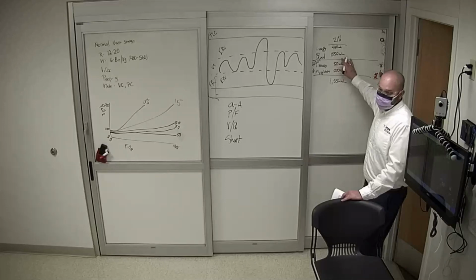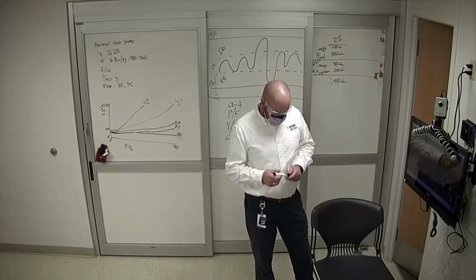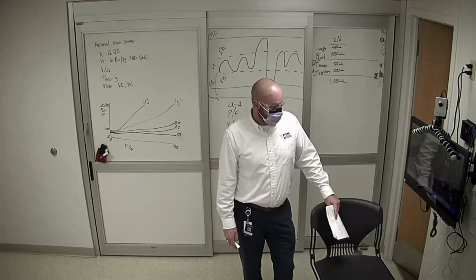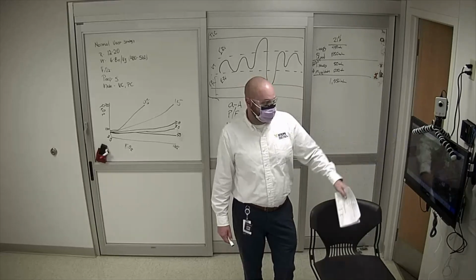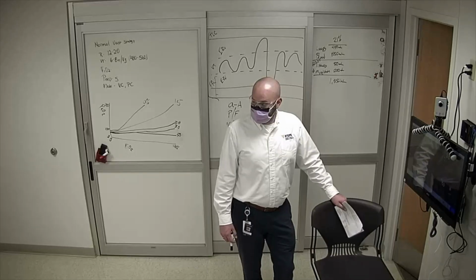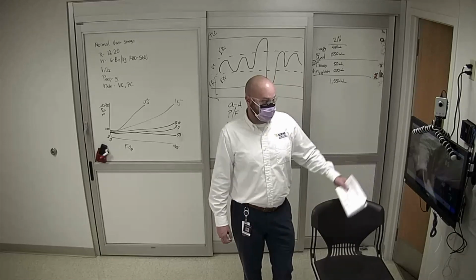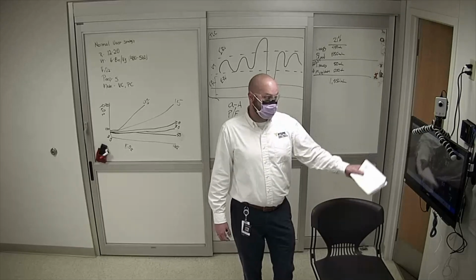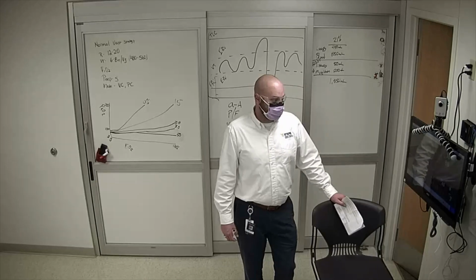Uh-oh. What's going on? It seems like our oxygen's dropping faster than our CO2 is building. So oxygen's definitely falling. What's going on with his heart? Starting to get PVCs, that you were speaking of. We talked about that a little bit earlier, didn't we? So his heart's getting hypoxic again. His saturations are falling, CO2's up. He's at 51 now. What do you think? Is his O2 falling, or his CO2 rising faster? I would say the O2's falling faster than the CO2's rising.